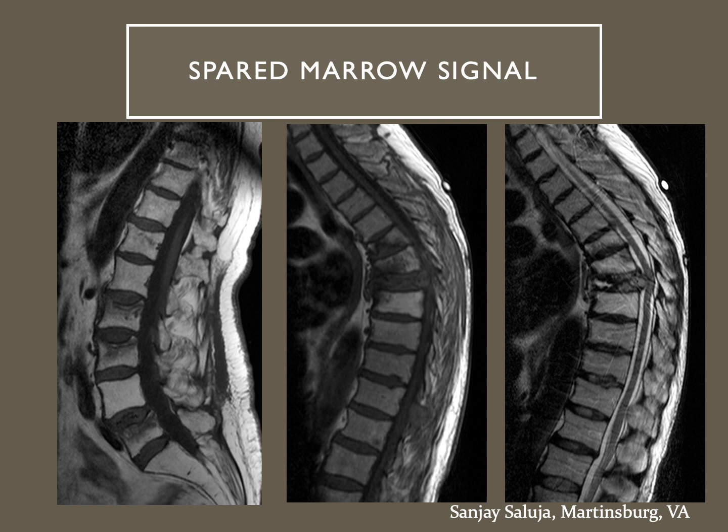So here is an example of somebody with an osteoporotic fracture in the image on the far left. It's one that you've seen already. You can see the vertebral fractures, but you can see on the T1 weighted images that the fatty marrow is still maintained. On the other hand, when we look at the two images on the right, what you can see is there's complete collapse of the vertebral body, and there is almost no healthy fatty marrow within this vertebral body. And therefore, this is a classic example of a malignant fracture of the vertebral body.